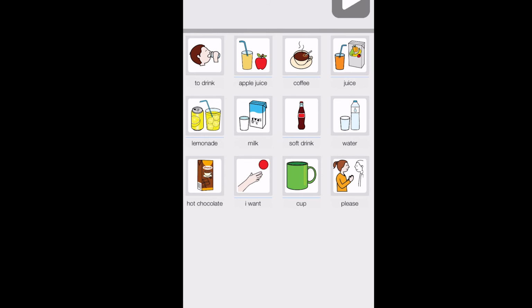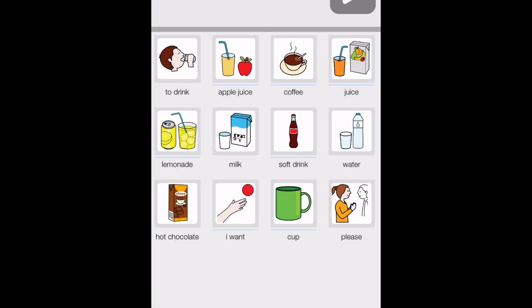take pictures of yourself, maybe doing the sign of please or whatever you want. But the biggest thing that I love about this is it has the flexibility. You could even draw a picture and take a picture of the picture, or take a picture of the kiddo signing. That would be even better. That would elevate it even more.